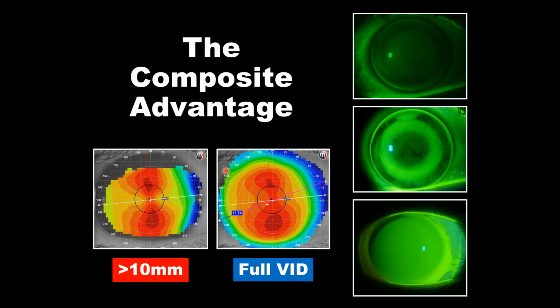And the composite capture was made to provide an understanding of as much of the cornea as possible. So this tool that Medmont has created allows us to image 100% of the cornea.